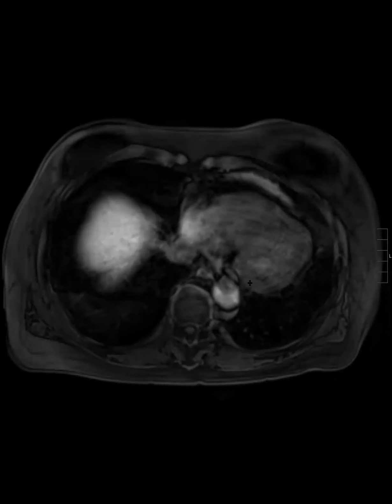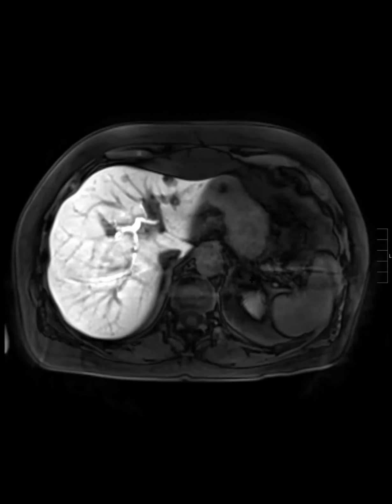Any thoughts? Tumor, I'm guessing, right? If you're saying there's no soft tissue around it and no diffusion, so probably not a tumor downstream, so a stricture from something else. Yeah, that was our differential, like a benign stricture downstream that's causing upstream biliary dilatation. The other possibility was biliary lesions, which we had also proposed. So we recommended a hepatobiliary study with Eovist, and this is what we got subsequently.